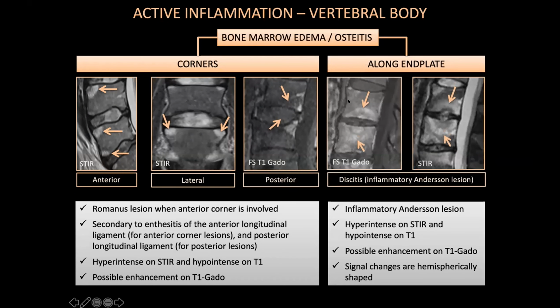When the signal abnormalities are along the end plate, these are the aseptic discitis. This is a nice example of that. Same signal characteristics and variable contrast enhancement after injection. And this is also described as inflammatory Andersson lesion.